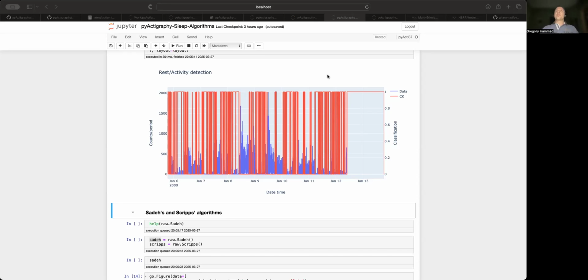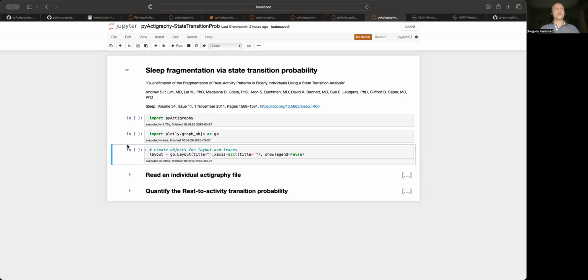Something that I like, maybe I will show you, because I prepared it. This one I like because it was the first time that we encountered a metric in one of the proprietary toolboxes shipped with a certain device.